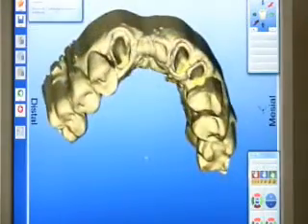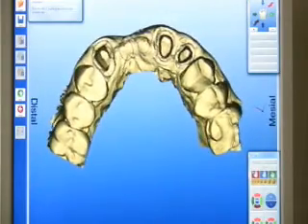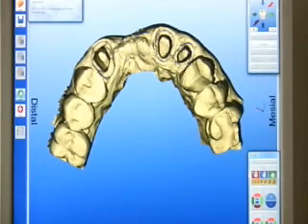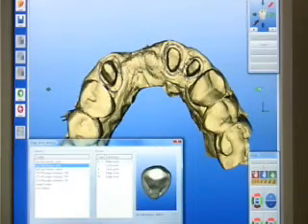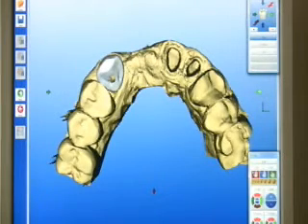After your margination has been completed, the software will ask you to correct the insertion angle using the left mouse button and the trackball. I find it beneficial to rotate the model so the midline of the palate is in a vertical orientation. You will now go through the normal steps for database restoration. The software will ask what catalog you would like to use as the basis of your restorations.